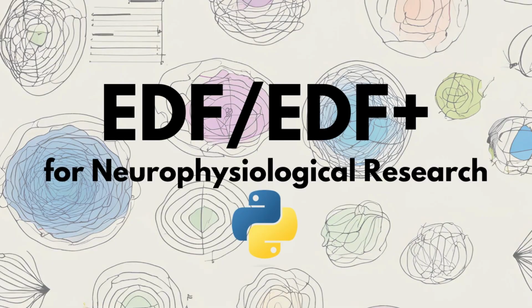And how do you pragmatically use these formats for experiments? In today's short video, we'll take a deeper look at the EDF data format and use a real sleep study dataset to programmatically open it using Python.